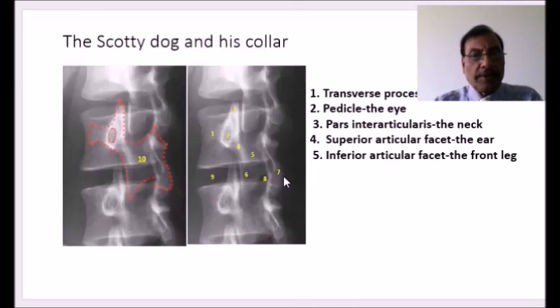Now, how to recognize spondylolysis? Spondylolysis is characteristically recognized by a dog made on the vertebra in the oblique view, whose neck or collar is disturbed or cut. Let us understand how to make the dog in the oblique view of the spine.